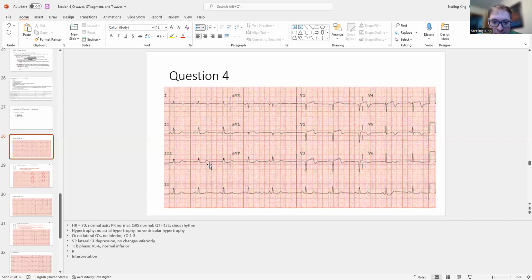And now let's look at the precordial. We're going to be looking at this ST elevation here. We already looked for a Q wave, which we think is there. So it looks like it's up. That looks up. It has to be a little bit higher in V2, V3, like 2 millimeters instead of 1. It looks like it's at 2 millimeters. And this doesn't look like it's elevated.